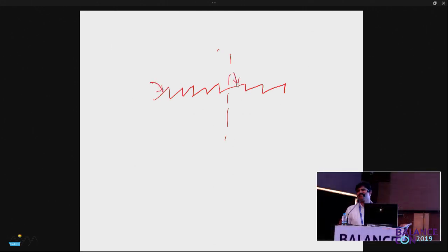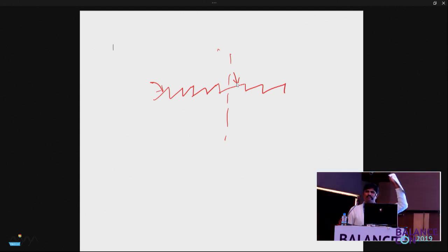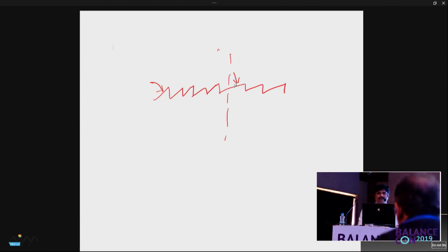Which is slower? The second slow phase is slower. All of you agree? The slow phase slope is lesser, or the slant is lesser under the green compared to the slants of the lines just before the green. All of you agree? In the workbook? So that is fixation suppression.